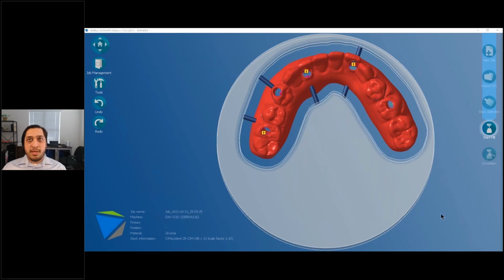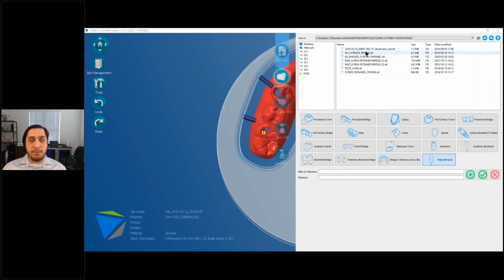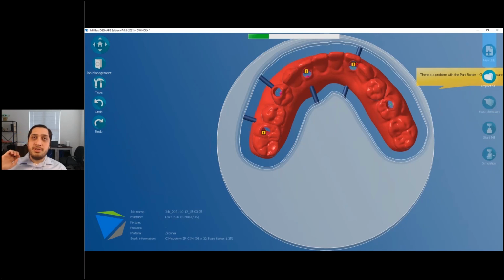The last talking point that I want to talk with you guys about is going to be the abutment screw hole obstructions and errors that we detect with files. This is particularly an important issue for anybody that's doing CAD/CAM, regardless of your CAM software, regardless of how good you think your milling strategies are, your templates are, or even the detection of your CAM software. At the end of the day, there are just certain features and certain problems with STL files that are irreconcilable to be able to CAM a file.